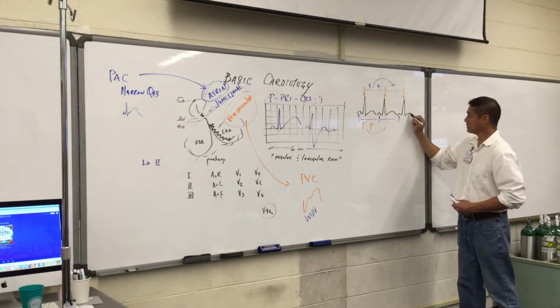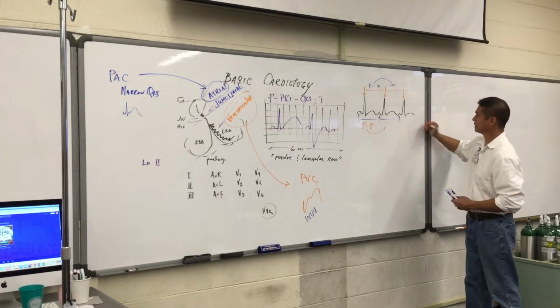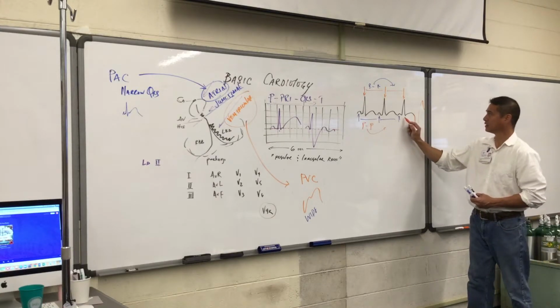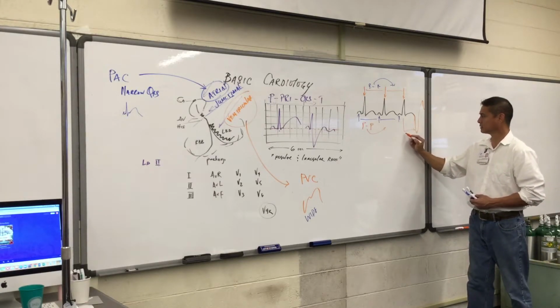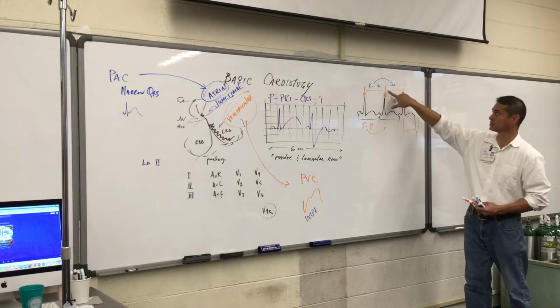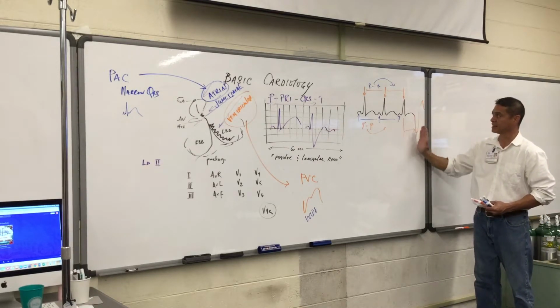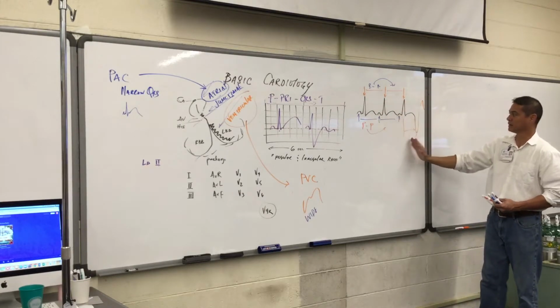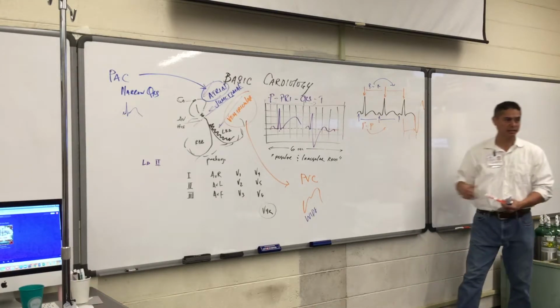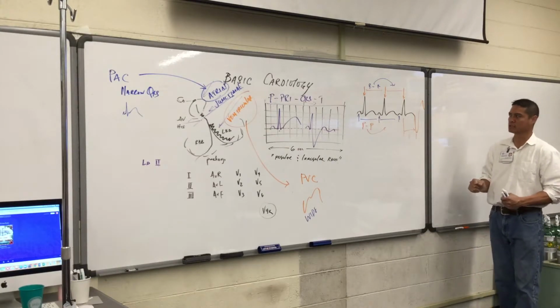When the ventricular contraction occurs, here you have that R to R criteria. This R to R is not as wide as this R to R here. So when we measure this, we can tell that it came early because these seem to be regular, but this one came really early. And it's wide. I tried to draw it in this orange fashion. Again, it's not always color-coded as we are drawing on the board, but here we don't have that normal configuration.